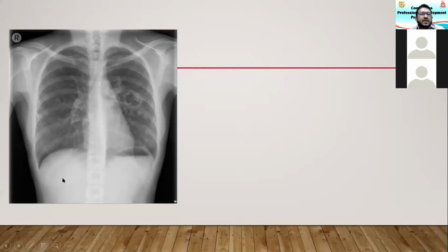Another common scenario in this part of the world, you can have patients who are coming with chronic cough, and then you will be seeing some irregular or regular cystic lesion on one side of the lung, which is a cavity. So when it comes to a cavity, there are a few things that you need to note. One thing is the wall. If the wall is regular and thin, it's likely to be a benign cyst. But if it is an irregular, thickened cyst, then it is likely to be a pathology like a cavitated neoplasm.